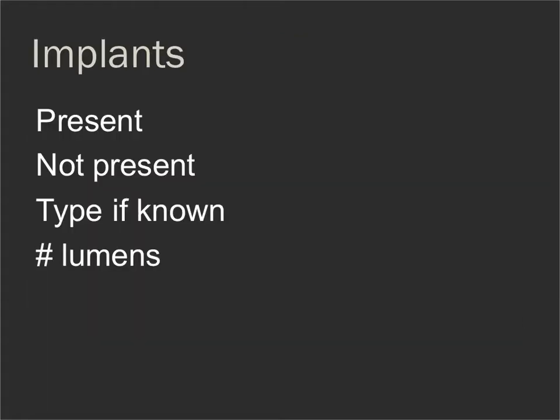If the patient has undergone breast augmentation surgery, you need to identify that, and then you need to say what type of implants they are, silicone or saline, and if they have more than one lumen.